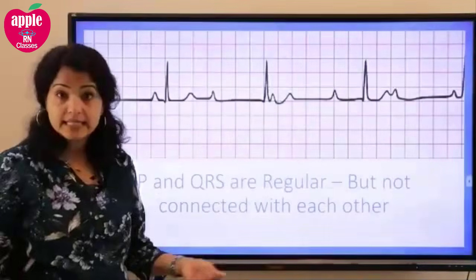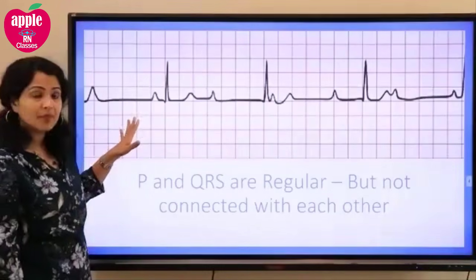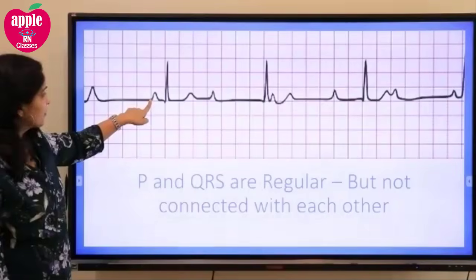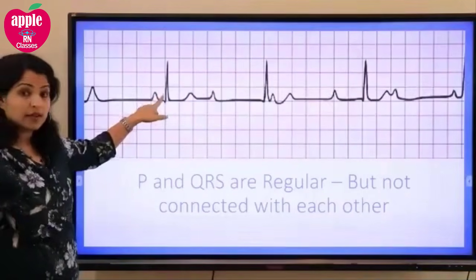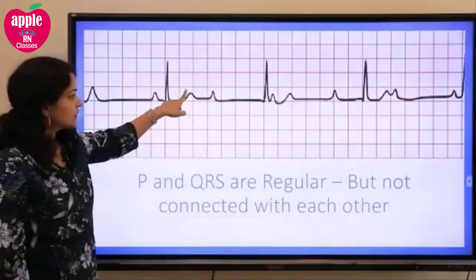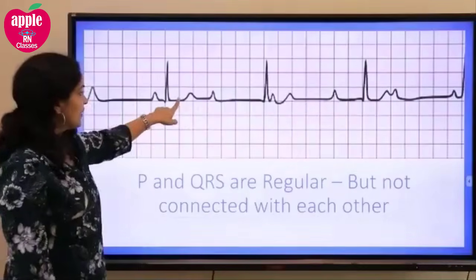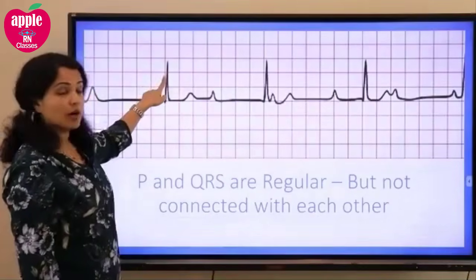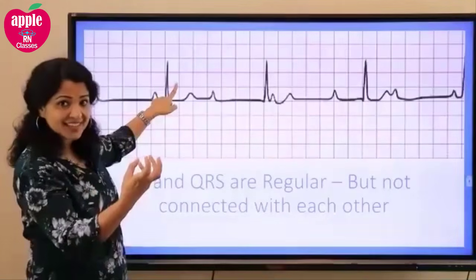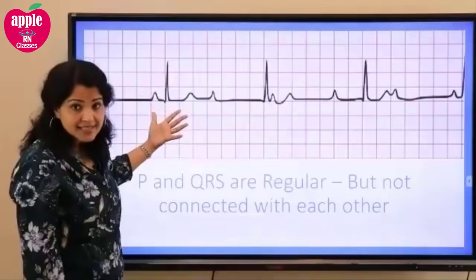But let me show you. This is the ECG. Right? In this ECG, if you look at that, there is a P wave. There's a P wave here. There is a QRS. Okay, that looks nice. Then there is something here happening, but there is no QRS. Okay, we can see the QRS is here. The contraction of the ventricle is there, and then there is a T wave, which means the relaxation is there.